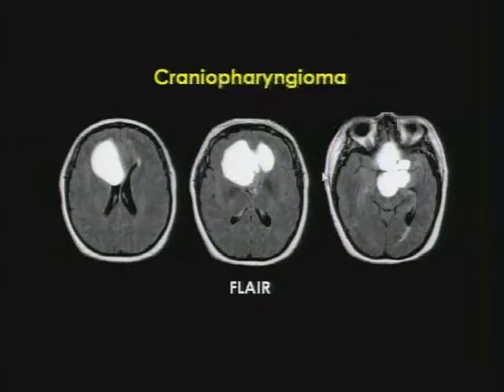Craniopharyngioma in children is relatively common, but these tend to be multicystic masses. If you wanted to confirm the presence of calcium, which can be helpful differentiating this from other types, you could always get a CT. But in my experience, sometimes CT does not show you calcium very well because the calcium tends to form around the rim, and the rim is really thin, it may not catch it. So with this multicystic appearance centered in the suprasellar cistern in a young patient, you should think about craniopharyngioma.